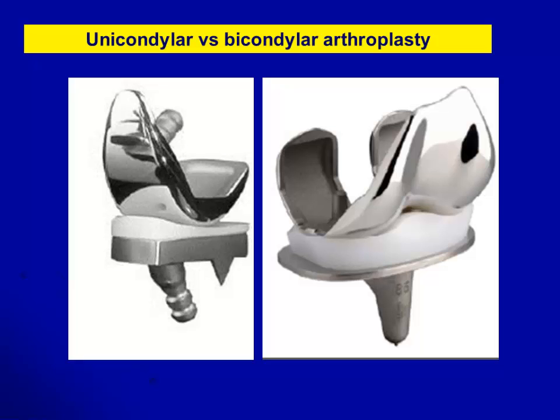So we'll talk about the anatomy. When you are describing a knee joint or whichever joint you are going to describe, you need to describe it according to the relevant anatomy. As a radiologist, I would prefer, when you talk about the tibia, you have medial plateau and lateral plateau.